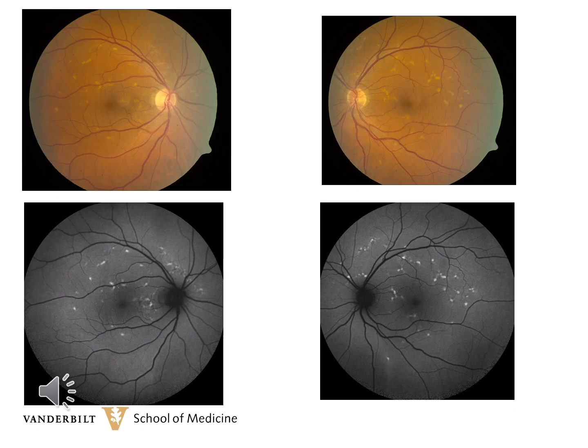The final group I'd like to present is type 4, or pattern dystrophy simulating Stargardt's. Most patients will have a good prognosis. This is a 58-year-old male who's had these lesions noted on a routine examination. The vision is 20/20 in both eyes. There's no family history of any degeneration, and the fundus autofluorescence shows these flecks very well.